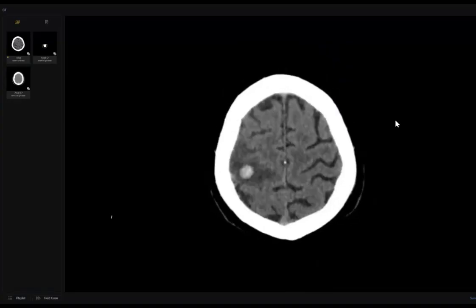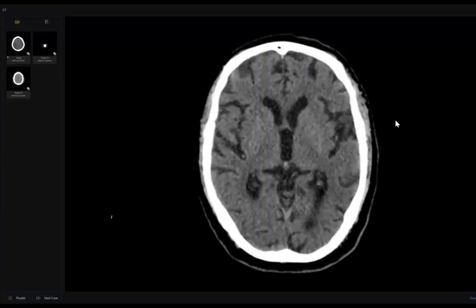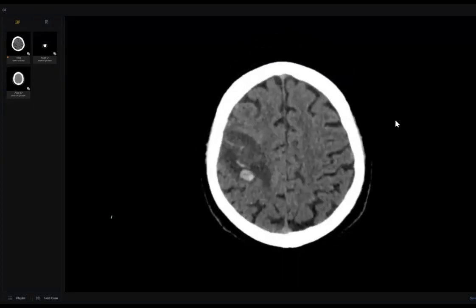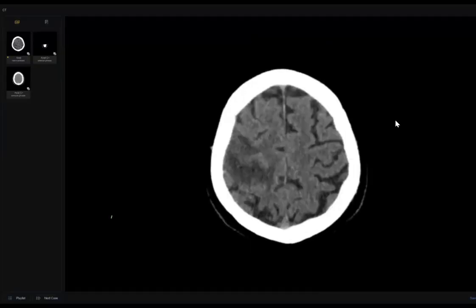I would like to review further. If any prior imaging is available, I would compare it with this, and I would also like to review other investigations, if there are any. Could you have a look in the most superior slice, please? Okay, sir.